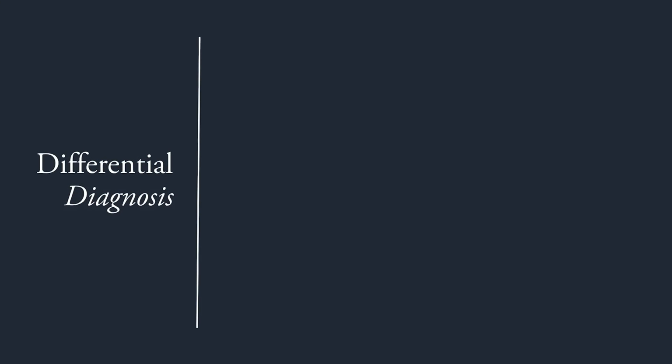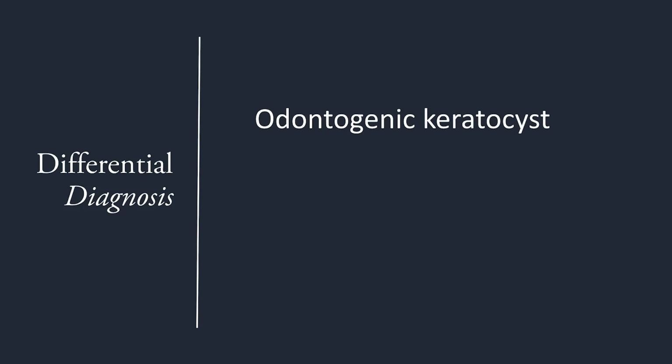The diagnosis of simple bone cyst is primarily dependent on radiographic features, followed by surgical findings. Histopathological examination is difficult because mostly there are no tissues that can be harvested. It's a cavity. The radiographic findings are often similar to odontogenic keratocyst. If the adjoining teeth are carious, we should also consider radicular cyst, particularly if the lamina dura is lost.